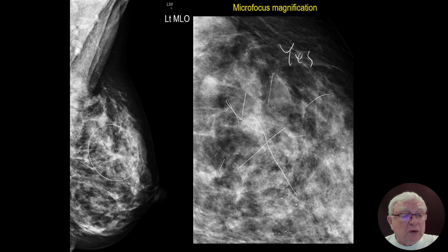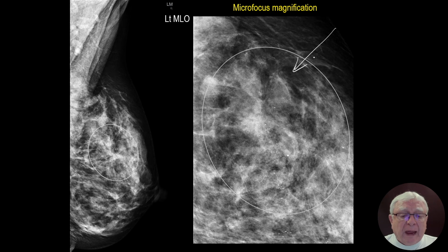Now, those of you who use tomosynthesis would see and pick it up easier, but the enlargement is working very well. Now, here we have something, and then we would say, let's take the calcification separately because they don't belong here. So it's an architectural distortion, and as we know, this was not palpable, so I immediately say, she didn't have surgery, she didn't have trauma. Traumatic fat necrosis out of the picture.